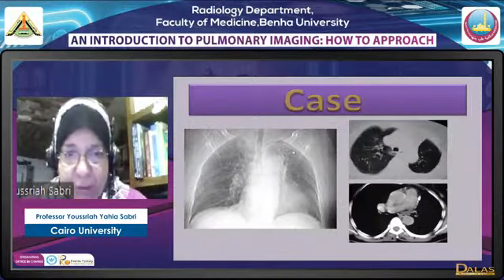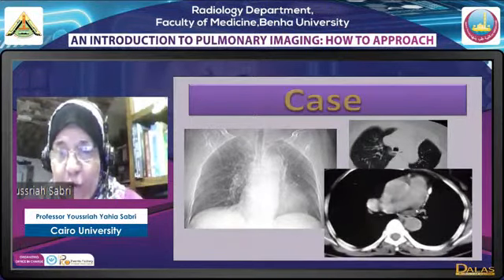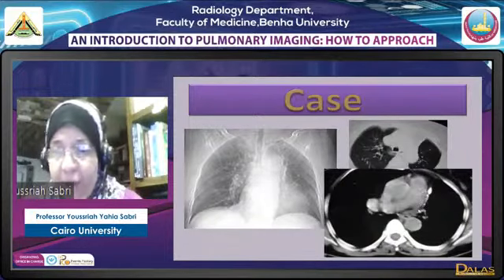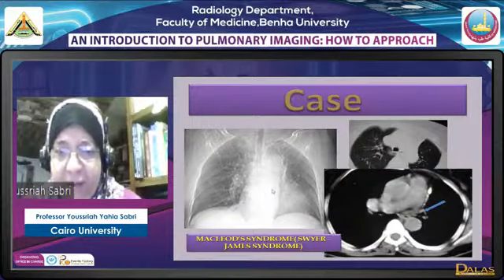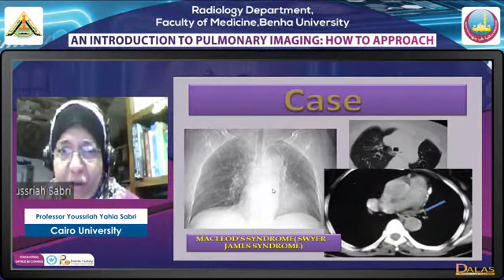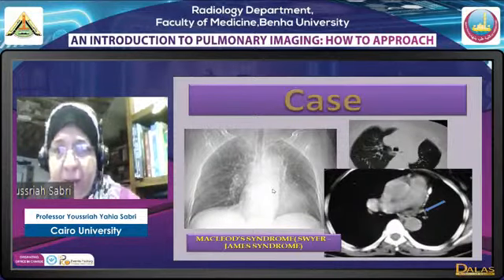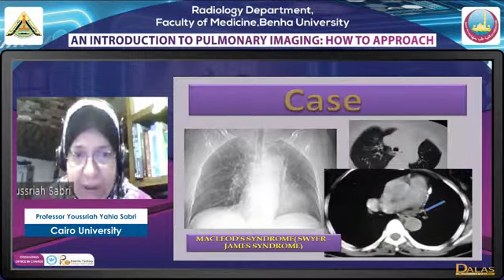Now here we have a small lung also, hyperlucent lung, but if we look here, there is nothing wrong with the configuration of the mediastinum or the heart, and there is a normal pulmonary artery, but it is a rather small artery with some calcification noted. This appearance we see in Macleod syndrome or Swyer-James syndrome. What is this? Well, it's not a congenital condition. It's a patient who very early in life had a severe unilateral chest infection or bronchiolitis, and then the lung becomes later on small with a small vessel supplying it because it's not functioning properly.